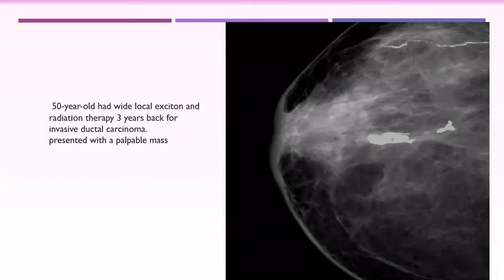If it gets fragmented, that means there is an underlying pathology making this dystrophic calcification fragmented instead of compact. So it will be suspicious.